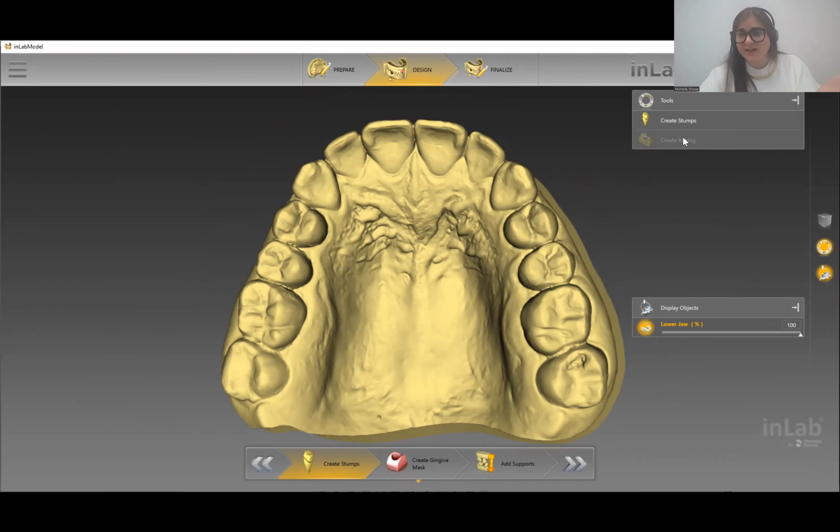But essentially what the analog is, it's known as a digital analog, and it's basically the implant replica. Okay, so your replica being what you're used to from a stone model perspective. Now you can identify the same workflow with a printed model by adding in a digital analog where you basically screw in the actual analog itself. So we use either ELOS or NT Trading analogs. I'll get into that more in a future, more advanced workflow video. But again, you do have the ability to create implant supported models.